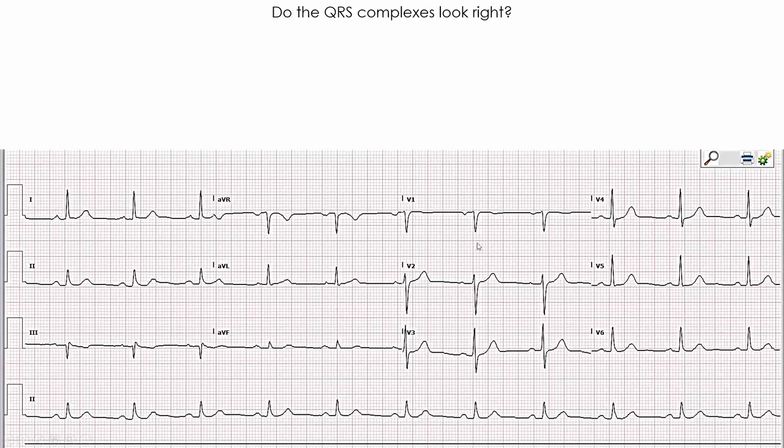And then we said we'd talk about Q waves. So, no Q waves here. Again, little R wave making this an S wave. So, no Q waves. No Q waves to be seen. So, not really much going on from a Q wave perspective. Maybe a small Q wave there, but again, it's small, so there are no abnormal Q waves in this ECG.